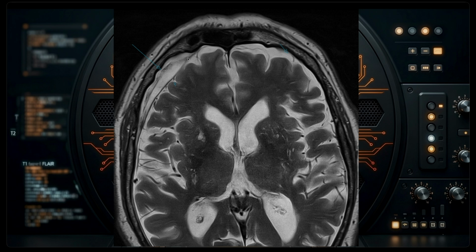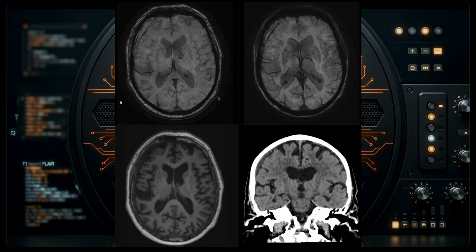The hallmark is the cortical veins that are crossing a normal subarachnoidal space that you can see on this normal left side. Here you can see that the cortical veins are shifted to the sides, and they stop on the sides of the subdural hematoma and do not cross it, and this is characteristic in comparison to, for example, widened subarachnoidal space.